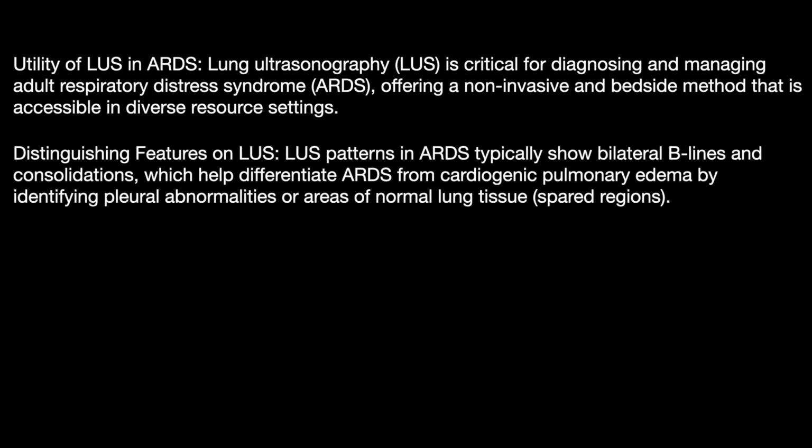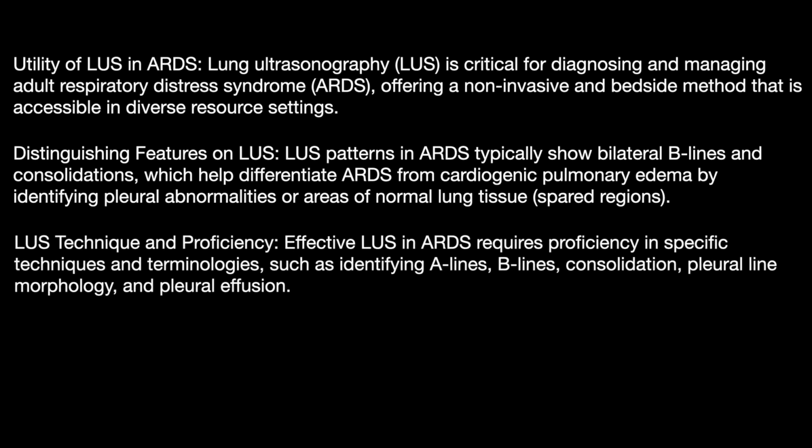Now, lung ultrasound patterns in ARDS typically show bilateral B lines and consolidations, which help differentiate ARDS from cardiogenic pulmonary edema by identifying pleural abnormalities or areas of normal lung tissue, such as spared regions.